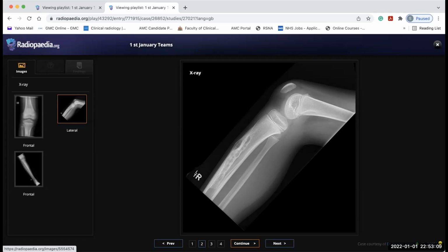In the anterior tibial cortex, we have another lesion which is quite characteristic. Adamantinoma is a correct differential. The other lesion which characteristically comes in this location is the chondromyxoid fibroma. Yes, chondromyxoid fibroma, with more erosion in the anterior cortex. But the age is the same; we can play with the age.